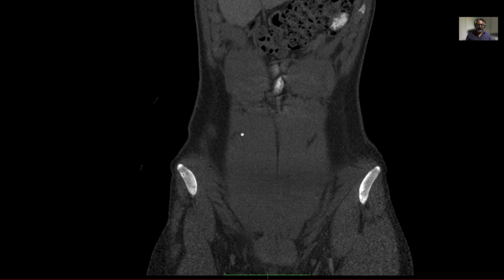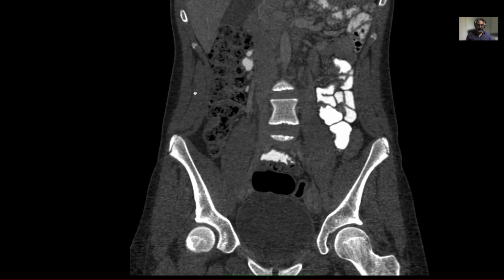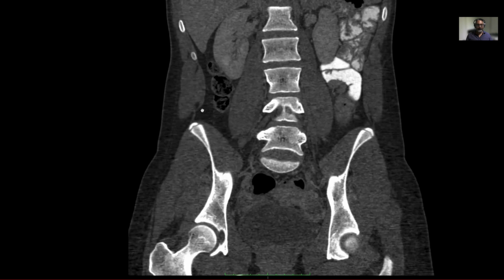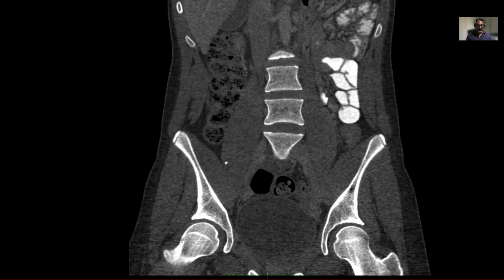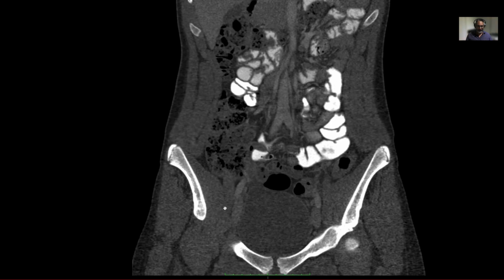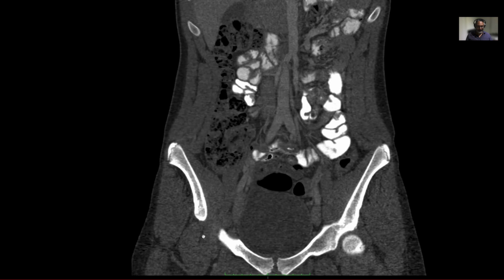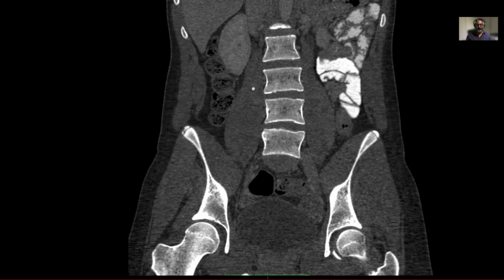So if you look here, now I'm going to move posteriorly. Those are your abdominal muscles, and do you see this muscle here? That is your psoas major. That's the iliacus. So if I keep moving anteriorly, you're going to see them come together and then move down and attach onto the femur. So that's your iliacus, that's the psoas that goes further up there.